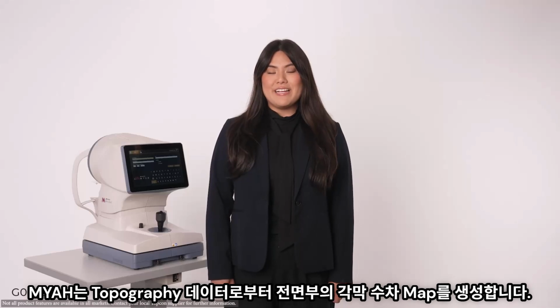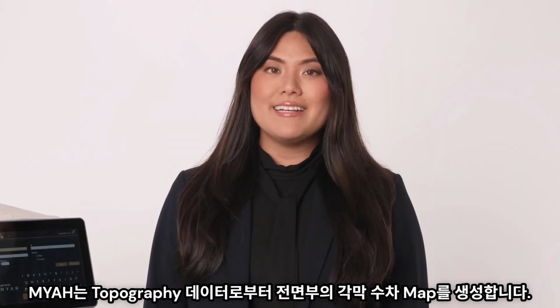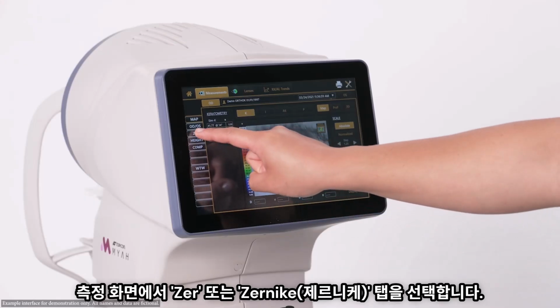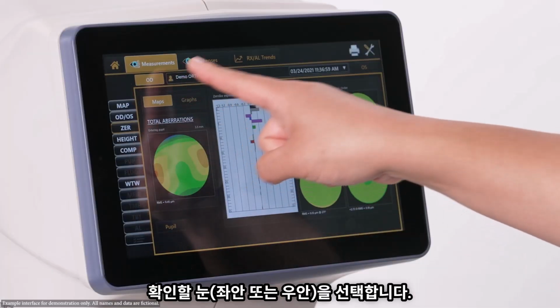The MYAH generates anterior corneal aberration maps from the topography data. Let me show you how to review this information. From the measurement screen, select the ZER or Zernike tab. Select which eye to view.